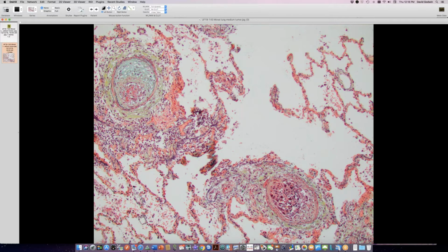We had one case here many, many years ago. I don't remember what the primary was, but same thing, sort of presented with rapidly declining shortness of breath, elevated right heart pressures, and I think they made the diagnosis on, I want to say, a bronch biopsy. Yeah. They took a chunk and got some blood vessels in there, but I don't remember that case being as exuberant, the extent of small nodules, but I like your MIPs because it really shows the distribution. Yeah. That's remarkable.